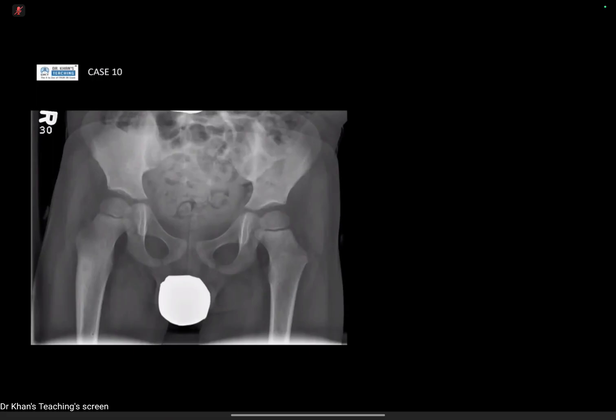Candidate 2. So I'm given a frontal radiograph of the pelvis of a skeletally immature patient with a gonadal shield on. I can see fairly defined sclerosis in the right proximal metadiaphyseal region of the eccentric cortex, and some lucency in the neck of right femur towards the trochanter.